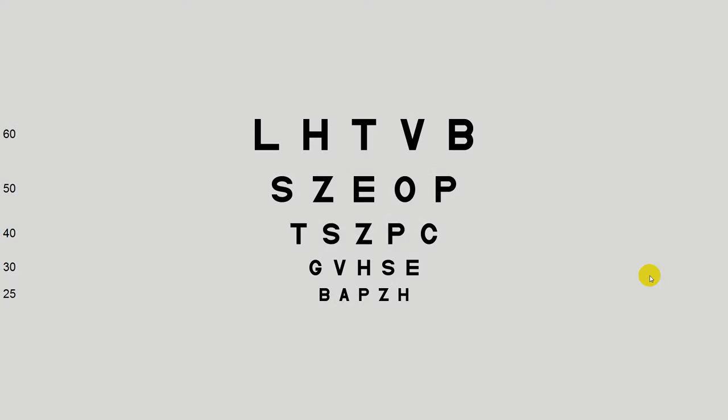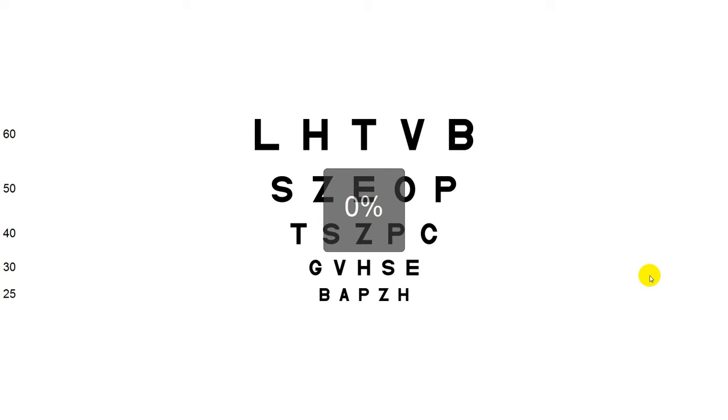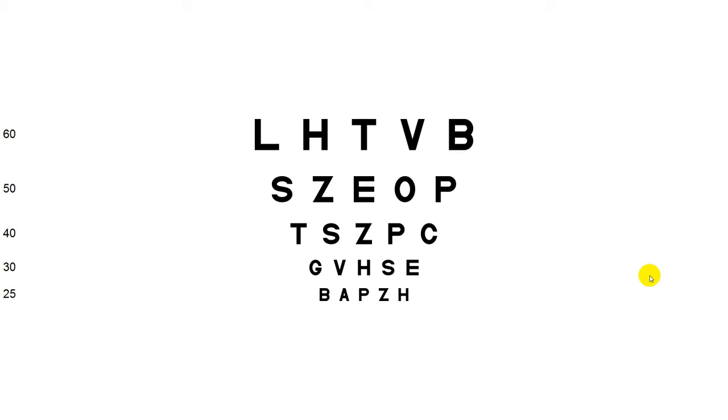The luminance is what I said about the luminance. There's that 15%. There's that 25%. And then there's that 40%. And then we click it again and it'll go back to full brightness. Other than that, there's a blank button. You hit the blank button, it'll turn it black. Hit the blank button again, it'll turn it back on. Other than that, that's about it.